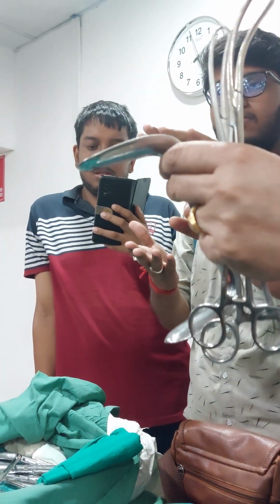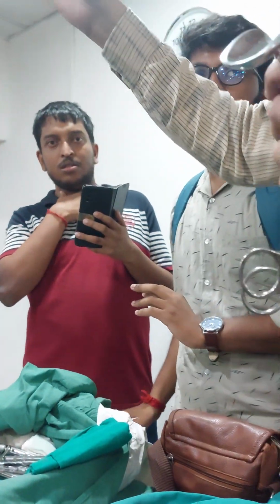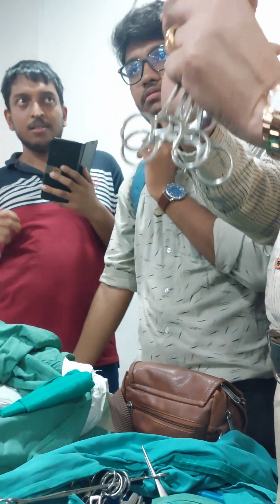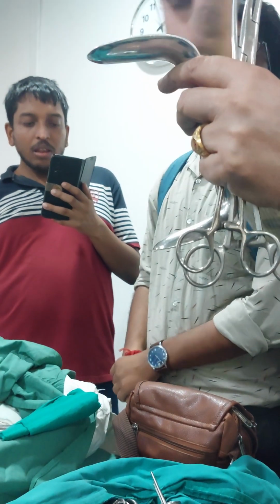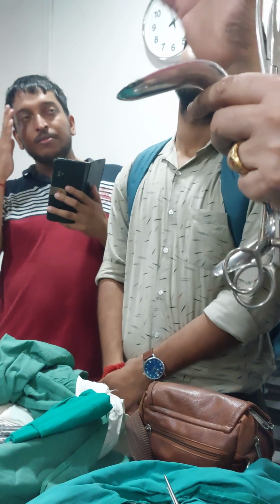When you hold it, push it down. Anterior and posterior vaginal walls can both be separated. With the same speculum, if the screw is in, that screw can be fixed, and nobody is required to hold the speculum. But the problem is that in Cusco's, you cannot do any manipulation inside the vagina except during colposcopy, where it is used. Colposcopy, you know.